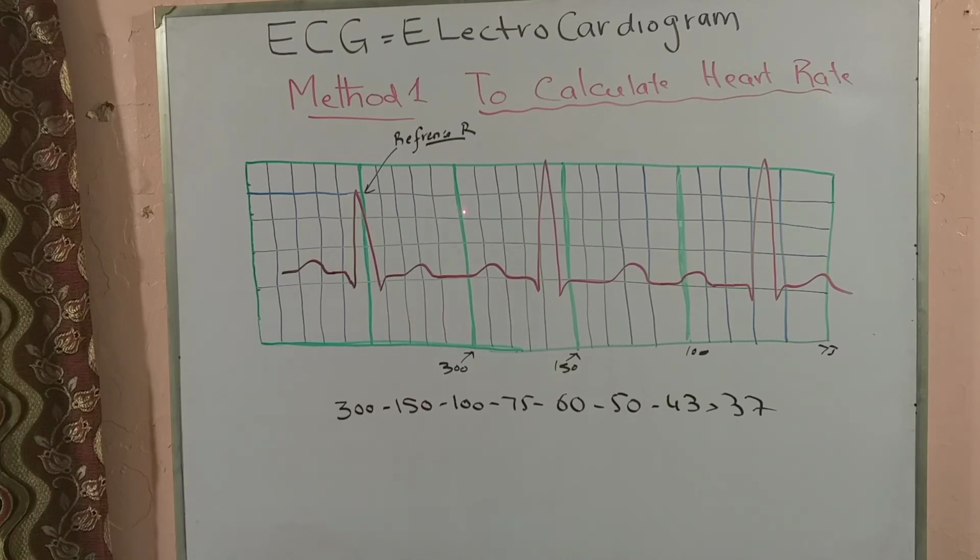So using method 1 is the easiest and most offhand way, because all of the other three require you to calculate it or use a calculator. So better to follow method number 1.